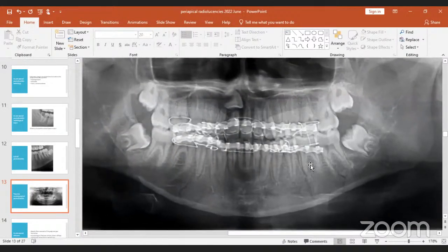So if you look at the body of the mandible, look at that area where we have the 6 there. We have this trauma and a fracture line that is extending. It's moving through the periodontal ligament space and going all the way to the body of the mandible. You can see it on the 7th there. So this is also responsible for causing apical periodontitis.